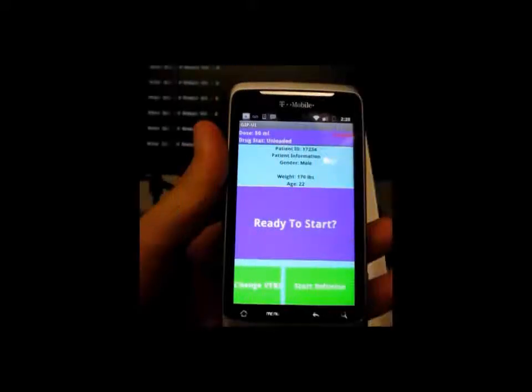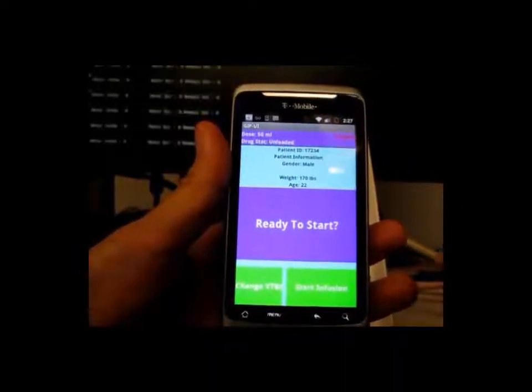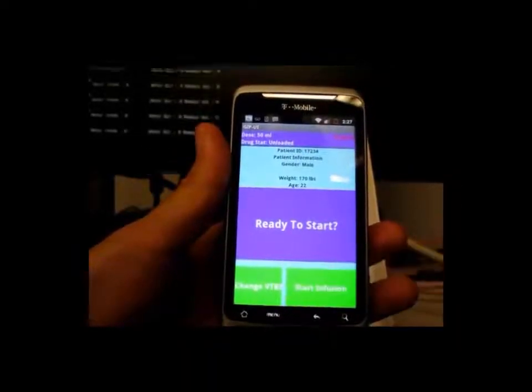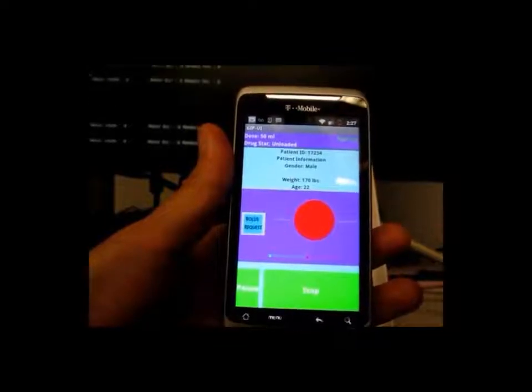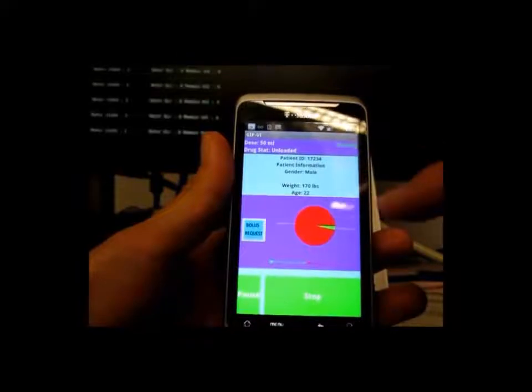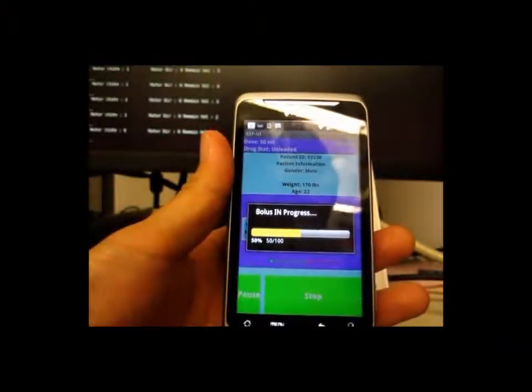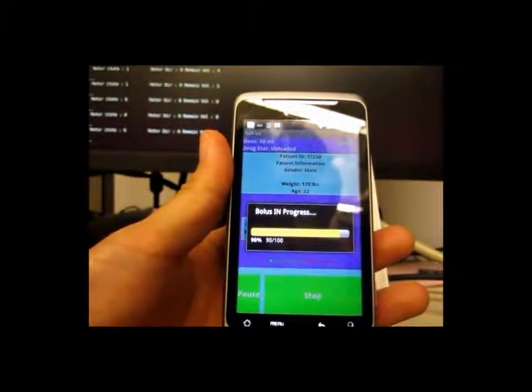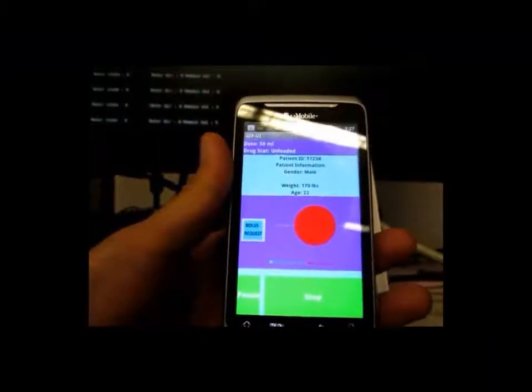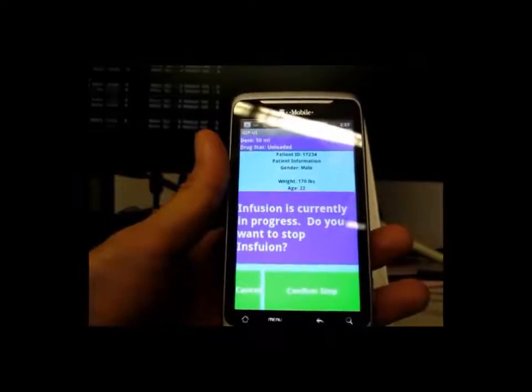PCA infusion pumps should provide an intuitive way to interact with patients or caregivers. The user interface is an important part of PCA infusion pump design. Information appearing in the user interface should correctly describe drug administration processes or alarm conditions so that patients and caregivers can take appropriate actions. The video shows an example of a user interface during the process of a bolus.